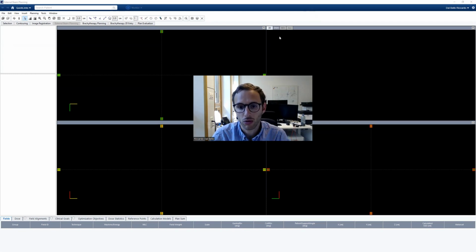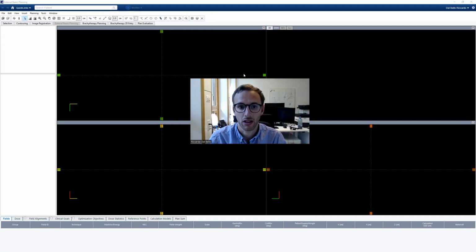Today, I will show you how to create and run very simple scripts in Eclipse, also called ESAPI scripts, to access and, if you wish, also modify data that you have in Eclipse. In principle, for what I'm showing today, all you need is a text editor. But this can be much more complex, and you might want to use some applications like Visual Studio, for example.